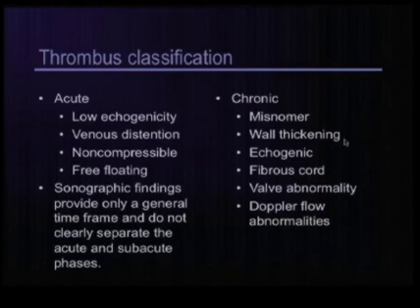There may be wall thickening, possibly with calcification. The wall thickening may prevent compression. You may see a valve abnormality or a scarred valve, and there can be Doppler flow abnormalities.